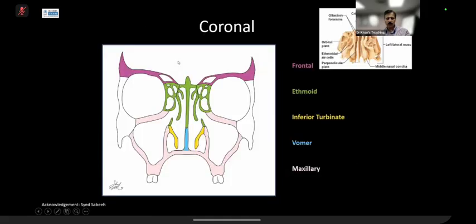Now, this portion is the horizontal portion, the cribriform plate. This thing is the crista galli, which is this thing. It's just a landmark because the dura attaches here, and I've shown you on a brain MR, it is beautifully seen, particularly on a sagittal sequence, because there is fat around it.